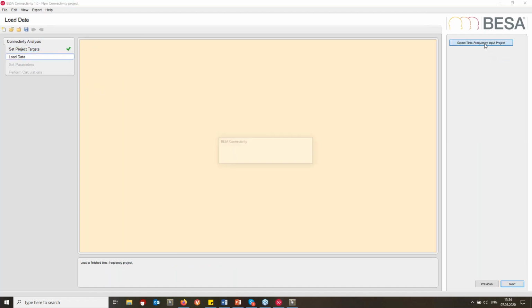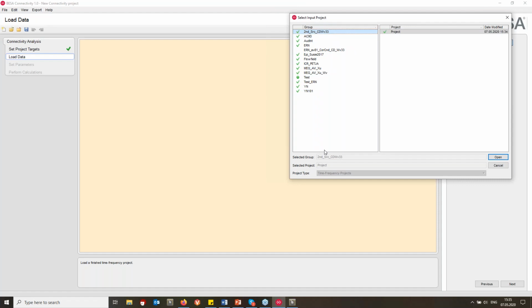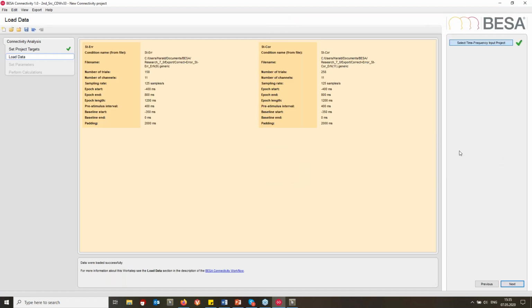So next, and select the project that already should have been selected. Oh, okay. I actually made a new group. So instead of giving the project a name, I gave the group a name, and then the project was just called project. Okay, but it's not lost, it's there. And let me then go further.